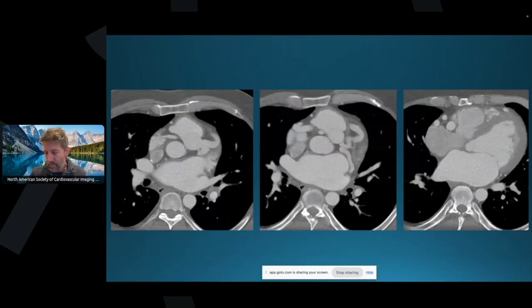That looks like an Arcapa. Like a what? Arcapa? Can you define Arcapa? Yes, anomalous right coronary artery arising from the pulmonary artery. Okay, so you're saying the right coronary artery is arising from the pulmonary artery? Oh, sorry. Wait a minute. No. Never mind. Sorry. Alcapa. It's on the left. The left coronary artery is arising from the main pulmonary artery.